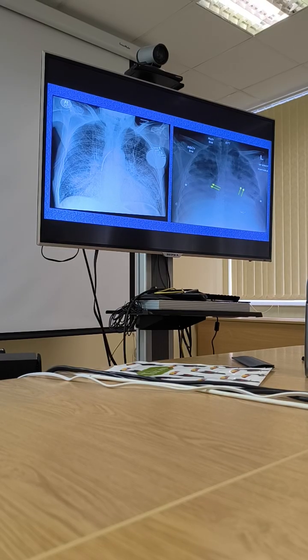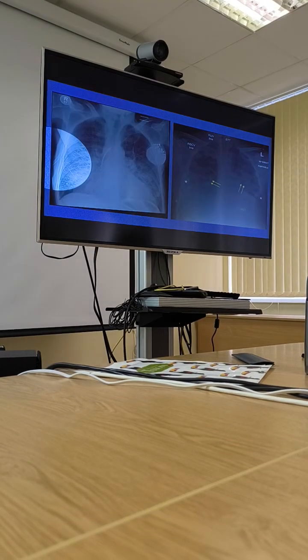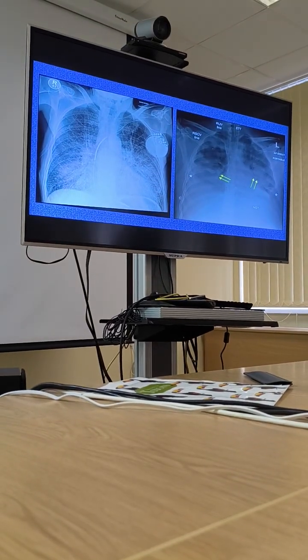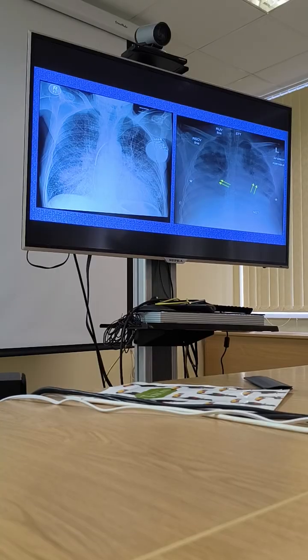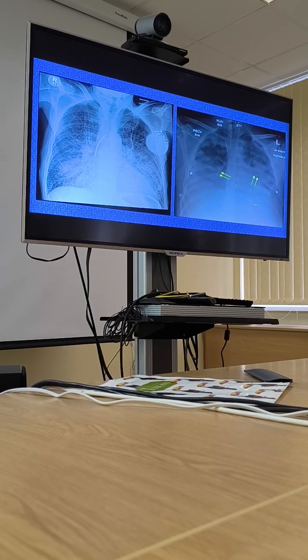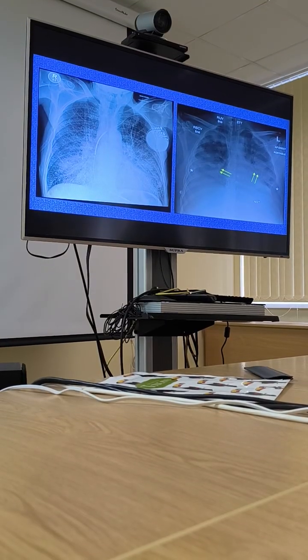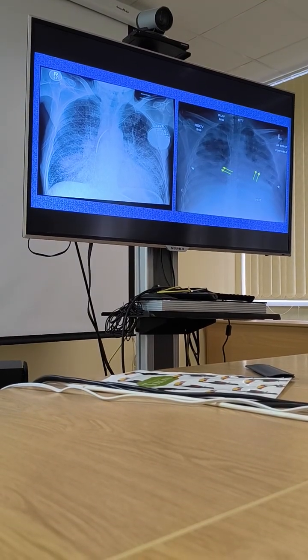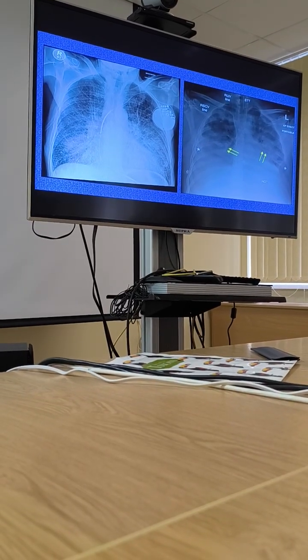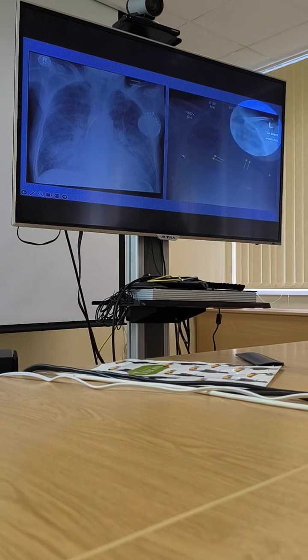Actually, I can imagine that this heart is a little bit in the shape of a bottle, and this can also be a part of cardiac failure, because that means that there is hydropericardium. This is how it can work. Well, not every time we see cardiac failure in this textbook manner. Sometimes we see it in a more complicated manner.